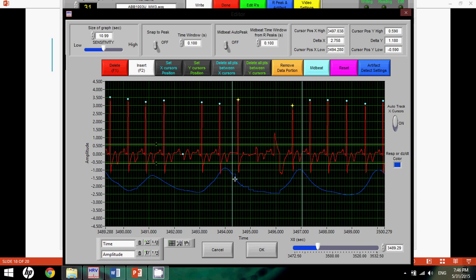We can see here that based on these squares, we're not getting a fluid RSP signal, which suggests that we're having drop packets as well. So because of that, we had both of these R spikes dropped. We would not want to assume that this is an R spike. It's very clear that there's a straight line and that this is not representative of an R spike. There's no QRS complex. There's nothing that suggests that that is actual real data.